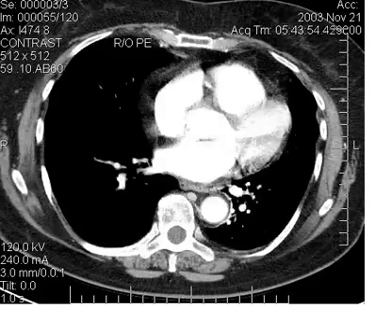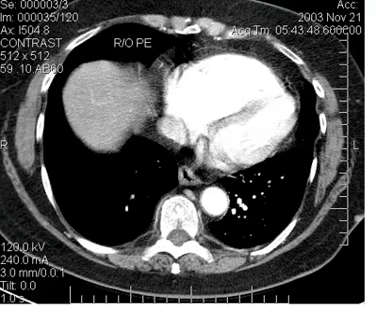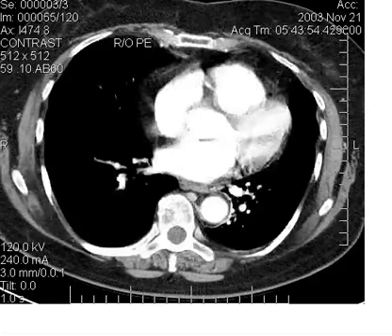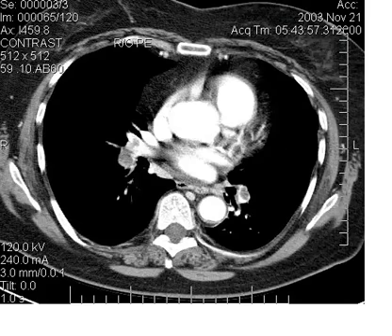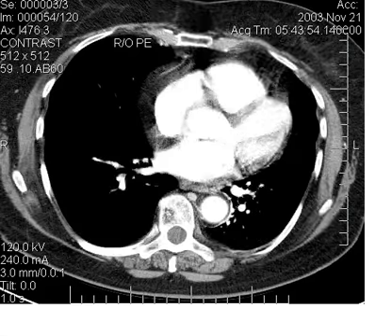Now, once again, following those down, you'll see how they intermingle with the pulmonary artery branches and can be difficult to distinguish, but you can follow them back up, and also if you change the windowing, you will see that the pulmonary artery branches follow the bronchi, whereas the veins do not. But usually that's not a big problem. Usually if you see a filling defect, you can follow it back up and say, oh yes, it is in fact connecting with that main pulmonary artery and its main branches.